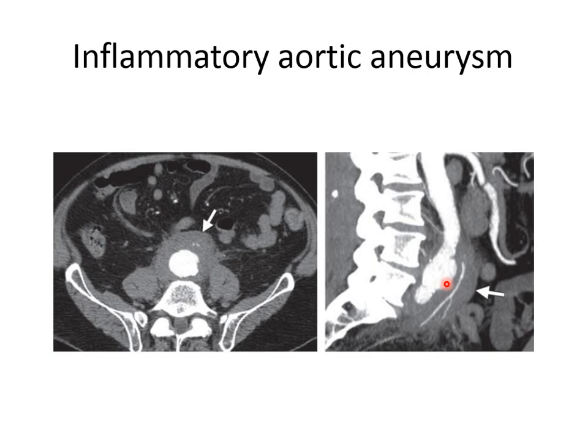But this is a good point to see that it causes thickening and perianeurysmal soft tissue fibrosis and sparing of the posterior wall. By giving contrast, there will be rapid opacification of the lumen, then late enhancement of the soft tissue mass.